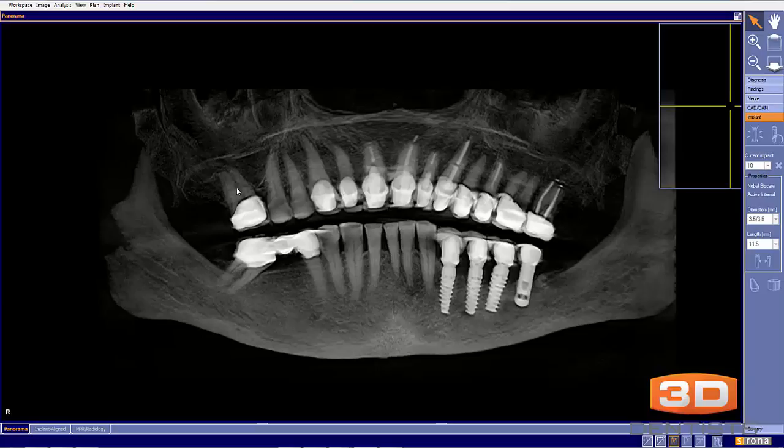I look at this, and I'm seeing only 2 teeth that have a good chance of getting CEREC data in. All of these teeth right here have circumferential metallic restorations on them, which makes for a lot of scatter, which makes bringing in the CEREC data a little bit more unpredictable. So part of me wants to say in a perfect world, this would be an analog case, but I would see if I could get the digital case in. What I would make sure of is that I have these 2 teeth in my CEREC data so that I can use that to get the data in.